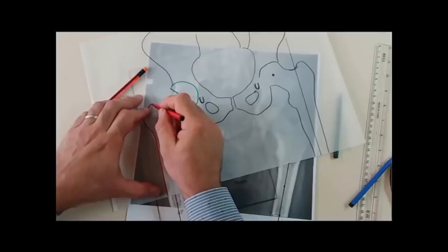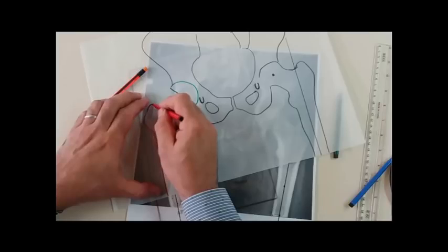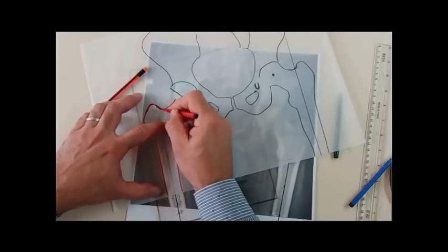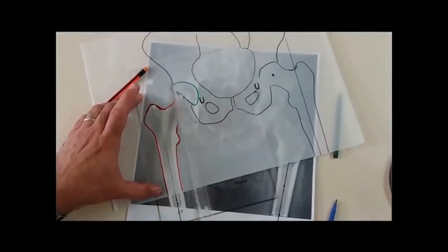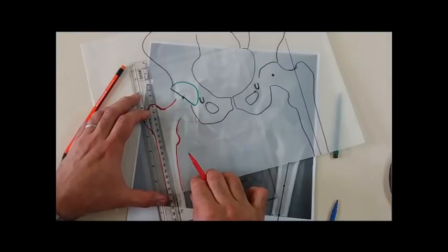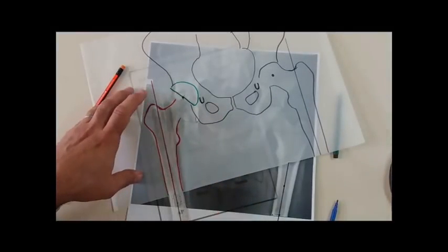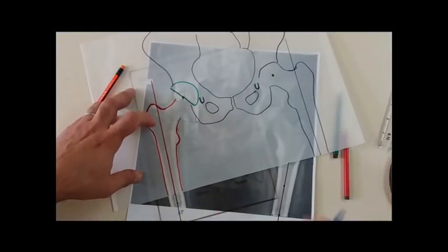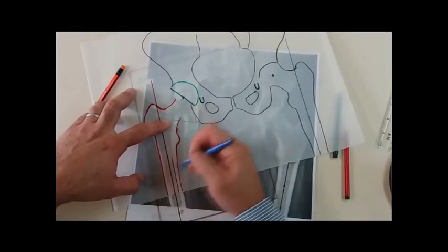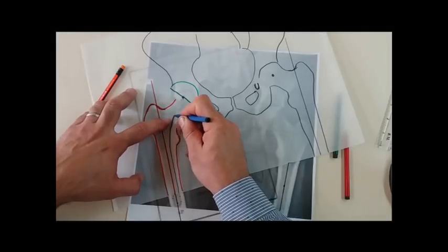The femur with all the landmarks that I have fixed in the first step, that's to say the greater trochanter, the lesser trochanter, the saddle area, as well as the medullary line of the femur. And also I will draw the stem, the templated stem.